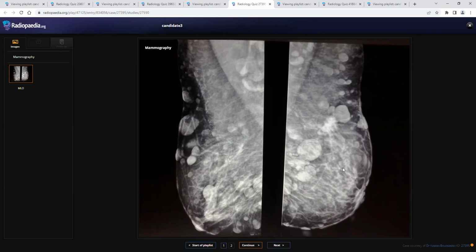As I mentioned, there is background neurofibromatosis, and there are multiple nodules. I can see some lymph nodes in the axilla, but they appear to be within normal limits to me. Okay. That's okay, fine.